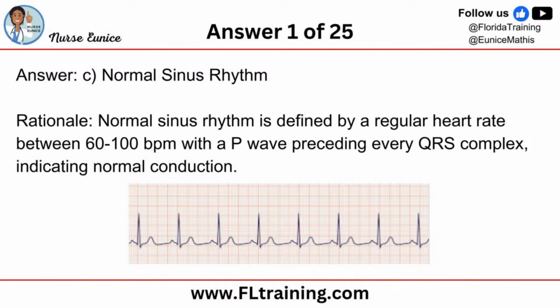If we have 8 QRS complexes, and this is a 6-second strip, what would be the heart rate? Let's see what you have in the chat area. And I'll be entering the answer also. Yes, that's a P wave, Mila. So we have a 6-second strip. Yes, Buck. We have 8 QRS complexes.